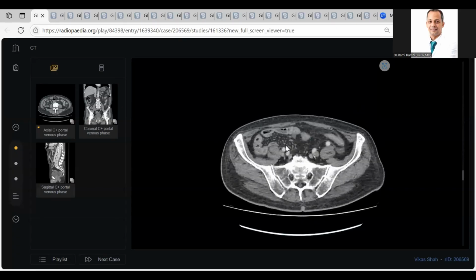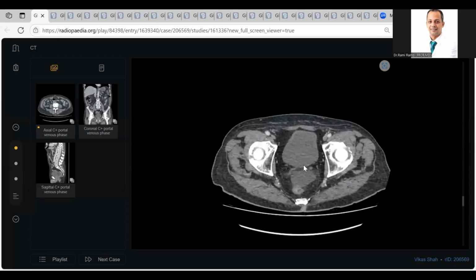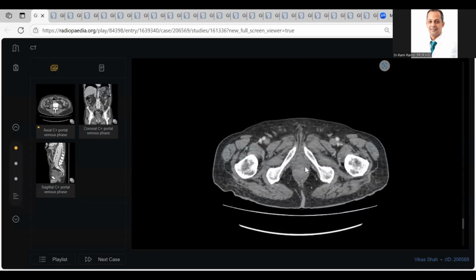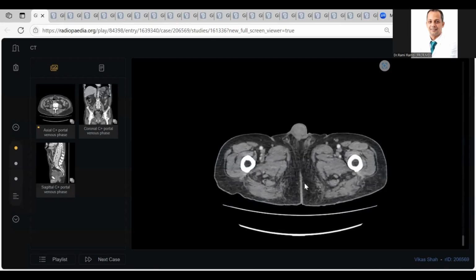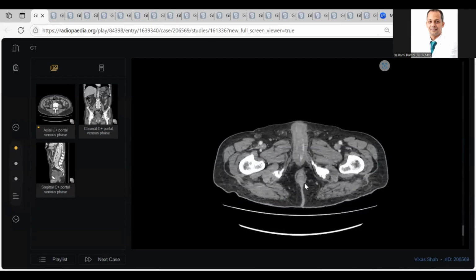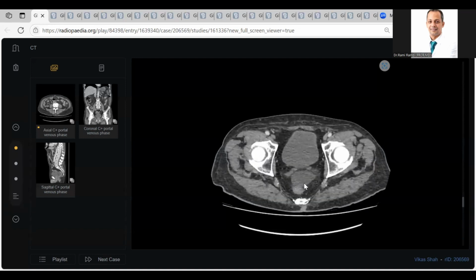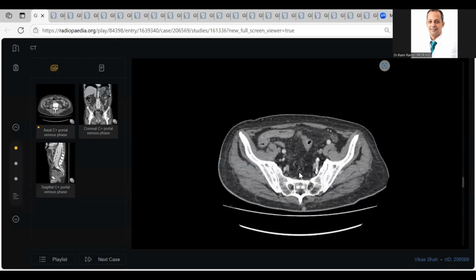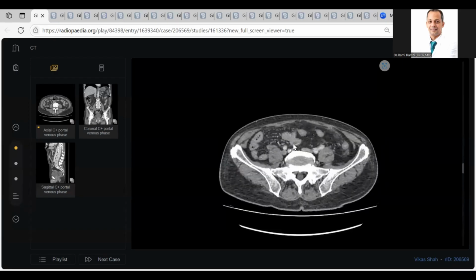I'm just looking at the rest of the lower abdomen. What is the colon? Can you see the whole colon? Why did you say hemicolectomy? I can't see the entire colon. Sorry, that was a mistaken statement. It's not a hemicolectomy. I think it's just a small bowel resection that has occurred, and there's an ileoileal anastomosis. Okay, tell me what happened.